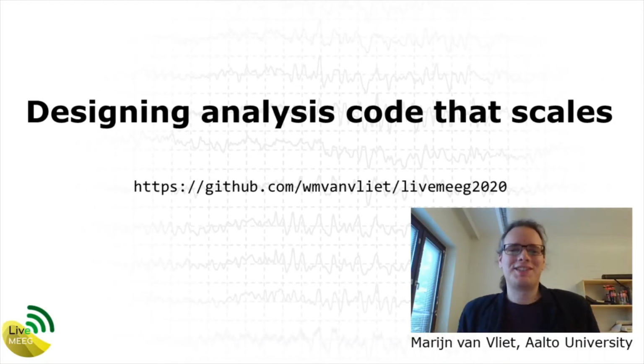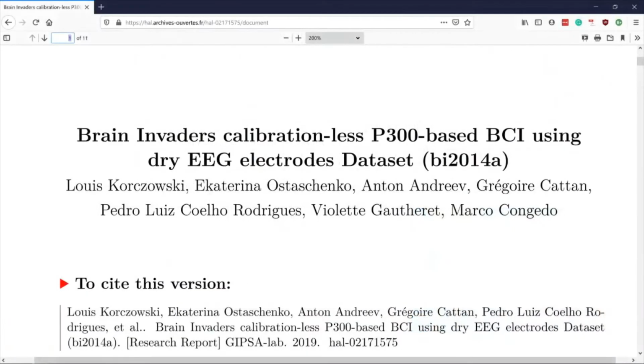Hello and welcome to Designing Analysis Code That Scales. I want to go ahead and analyze some EEG data together so I can show you my workflow. This is a workflow I find very effective when designing larger data analysis pipelines without everything growing out of control and turning into a Lovecraftian horror show. So let's dive right in and maybe you can learn a few new things.